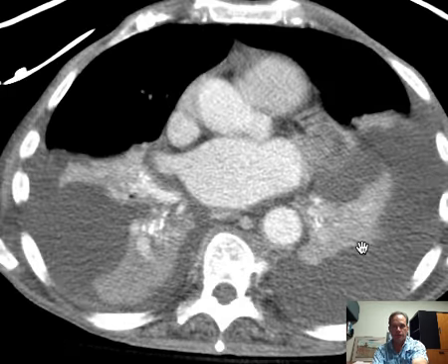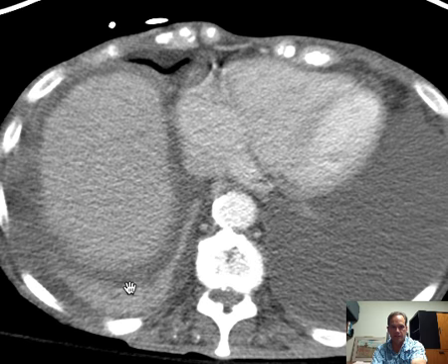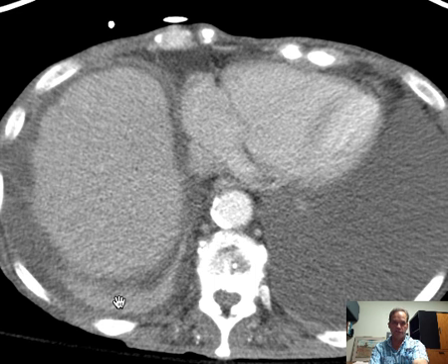So what parts of the lung are affected by this compression or compressive atelectasis? Well, here you can see that it's certainly the lower lobes, because you follow this all the way down, and that's the bottommost, inferiormost part of both lungs. Here on the right, still filling a little bit of the posterior costophrenic recess. The posterior costophrenic recess is that little curved, boundaried portion of the right hemithorax where the posterior part of the lung is shaped kind of like this, and the posterior part of it has a recess of that sort.